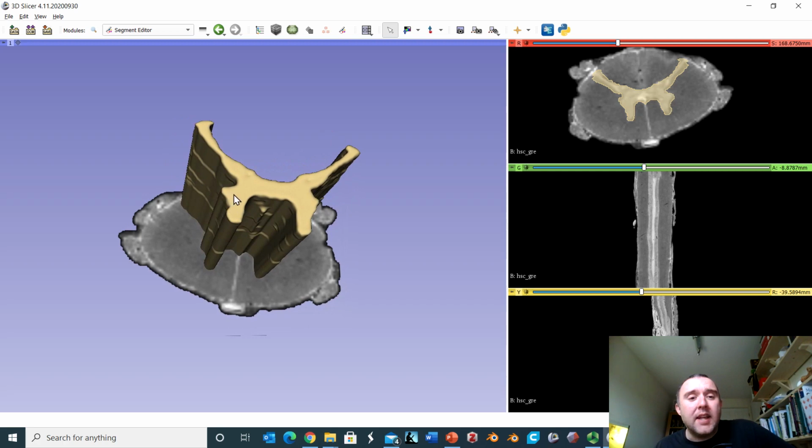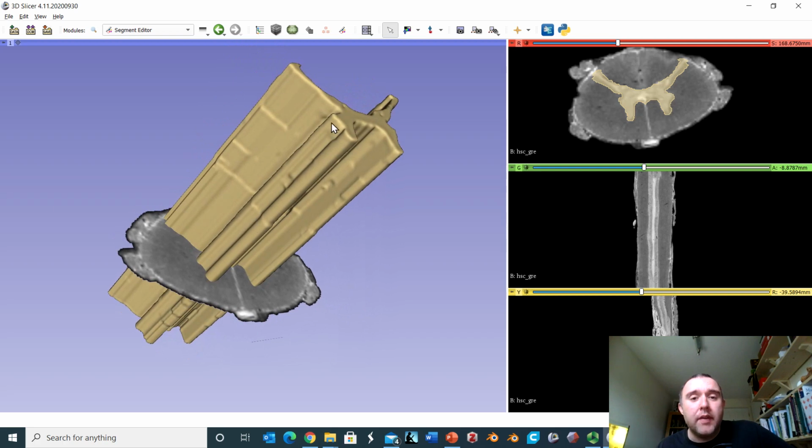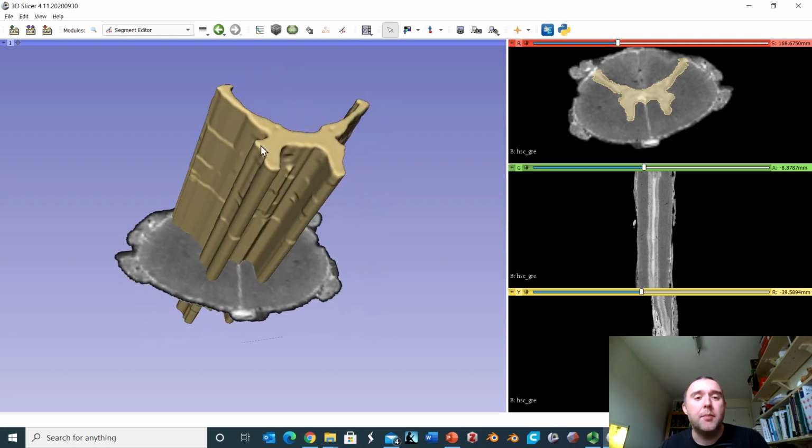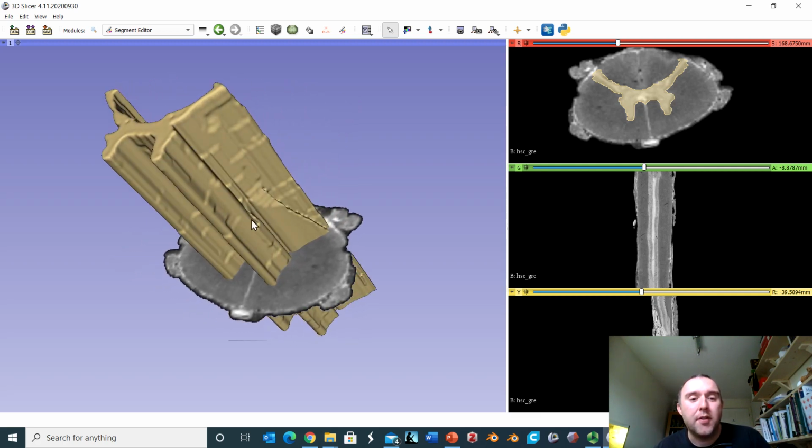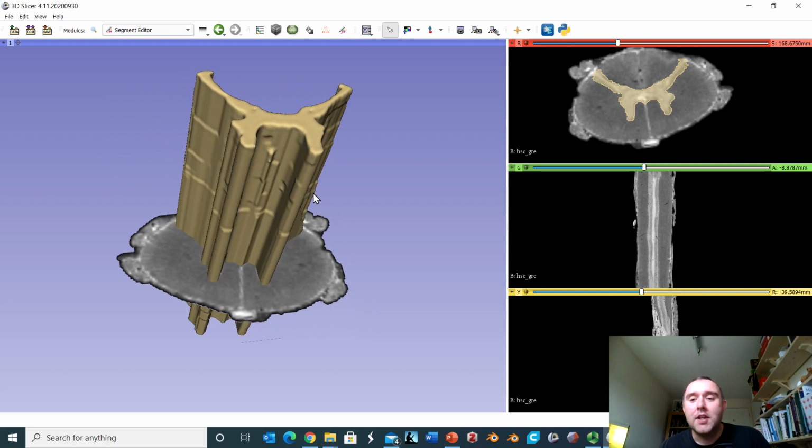And furthermore, we can see the lateral horn in the thoracic level. Now, once again, the lateral horn, like the dorsal and ventral horns, is a longitudinal column of neurons. And in fact, this has another name as well, known as the intermediolateral cell column. Intermediate because it's between dorsal and ventral horns, lateral because it's sticking out laterally. So this is the intermediolateral cell column, or the lateral horn of the spinal cord, containing sympathetic preganglionic neurons. And this really nicely demonstrates how this is a 3-dimensional structure. So that's the thoracic cord. Let's take a look at the lumbar cord now.